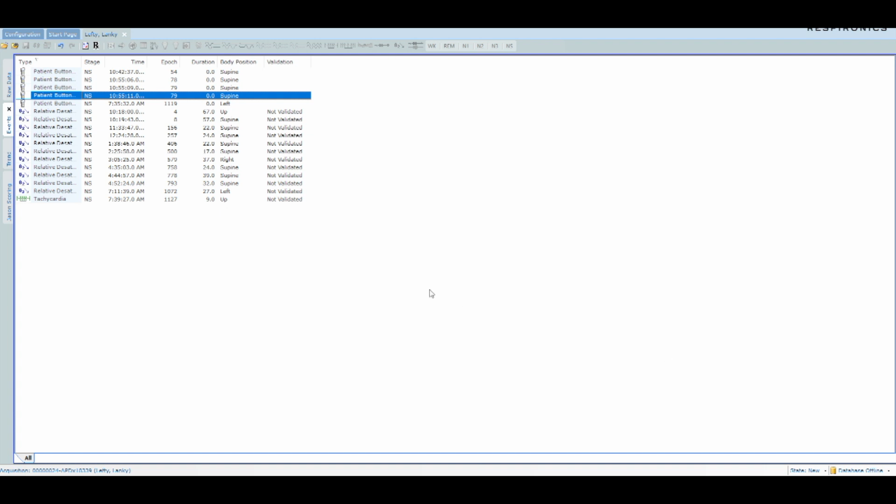This is one of the studies that I did when I was trying to figure out the INAP, the intermittent negative air pressure device. I did 2 studies of my home sleep diagnostic equipment, axgsleepdiagnostics.com, if you're curious. So here's what we're looking at.